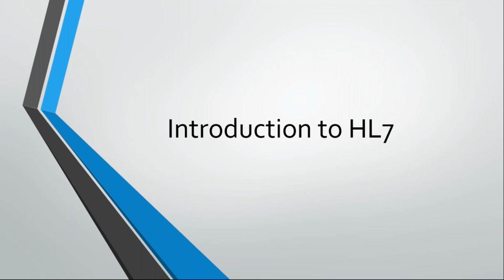Next, we'll be taking a look at the technical part, which is to go through Mirth Connect and learn about Mirth Connect from the beginning, understanding all the options that are available for us to implement an interface, and also to learn how to create an HL7 message out of the data that we extract from a database and how to interpret HL7 messages, write complex code to build transformations, which is to manipulate the data, and also to work on filters. So that will be the second part of the training.